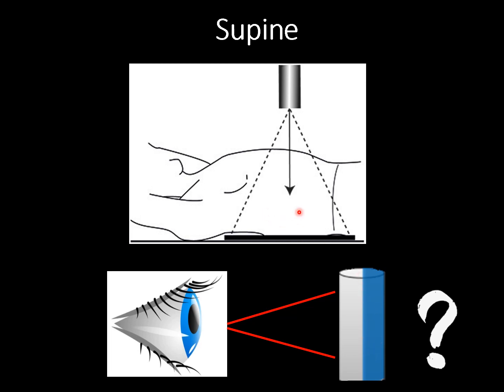So in this case, the patient's laying flat, any fluid within the bowel is going to settle dependently. Again, this is flipped up sideways, but this would be the dependent portion, the fluid settling down here. And then if we look at that, our radiation didn't cut through parallel with that edge. It just went straight through both interfaces. So we're not seeing a clear line between two different densities. This is just going to look as if it's one density because we're not seeing the contrast between the two. We're not cutting that edge in parallel.